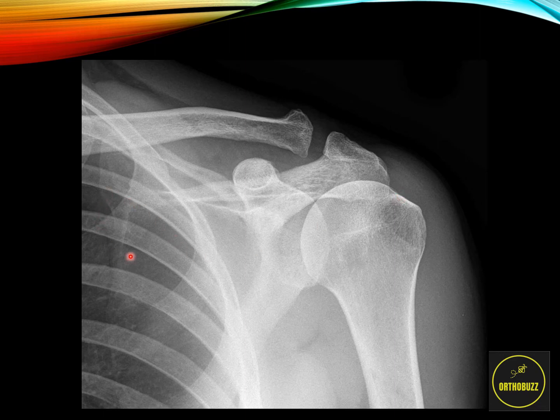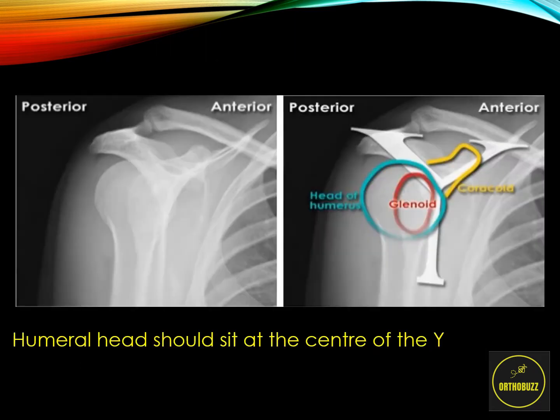We can see the ribs over here medially, and it's important to look at those, especially in patients with high energy injuries, as you can see rib fractures here sometimes. And we can see the proximal humeral shaft here as well. It's important to assess that as well, as there may be fractures over here, especially in the proximal humerus in elderly patients. Now, let's have a look at the lateral.